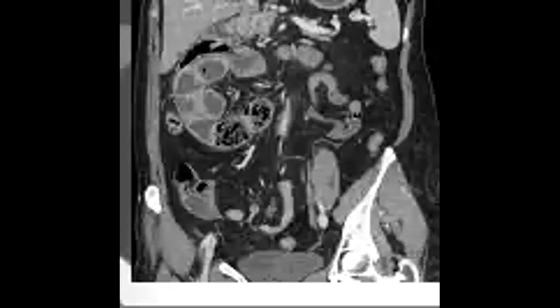And there is one cause of, let's say, localized bowel obstruction. We talked about this last lecture, but let's focus on this: if you find clusters of dilated bowel loops in an abnormal location, and especially if the keyword in the question says this patient had surgery, especially bariatric surgery, then you have to think about one of the most common causes, internal hernia.